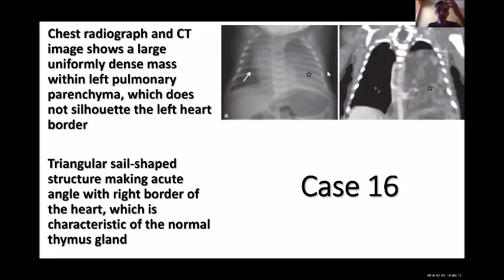Although it's cystic, it does not appear hyperlucent, it looks like a dense structure. For sequestration, there is a differential diagnosis, of course, and usually the echo can differentiate because this takes from the systemic, this takes from the pulmonary. This one is within the lung, the sequestration is outside the lung. And you can see how you differentiate it from the CPAM.